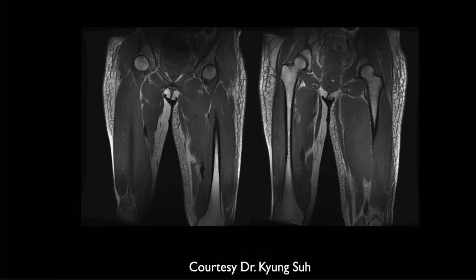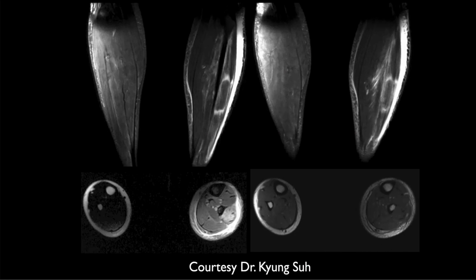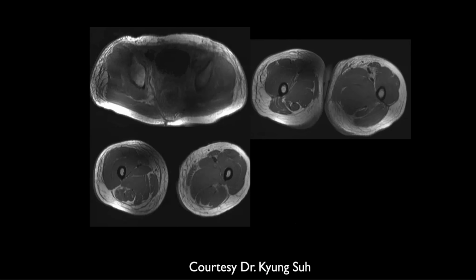And then you also see that there's coxa valga, right? Bilateral disease, but a little bit asymmetric. I mean, myositis, just after a week, maybe an infection. Okay.